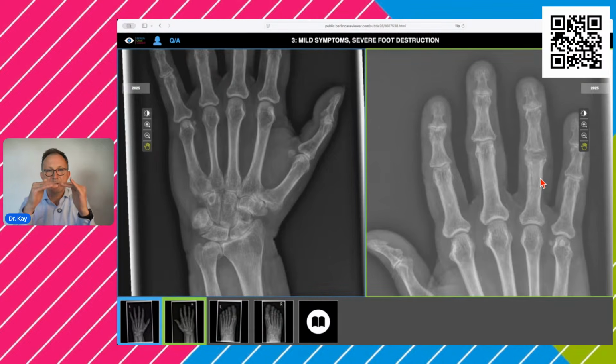So if you have a joint that has a subluxation, and then you insert this prosthesis, you have a nicely aligned joint again, and quality of life has improved. So that's a Swanson endoprosthesis. Don't know if you can see this. I think no, it did not go through.